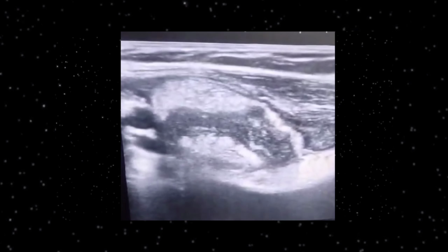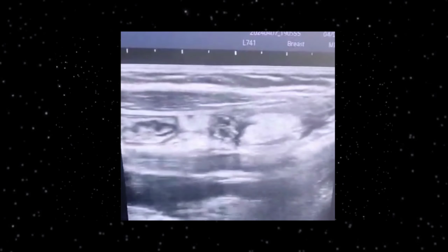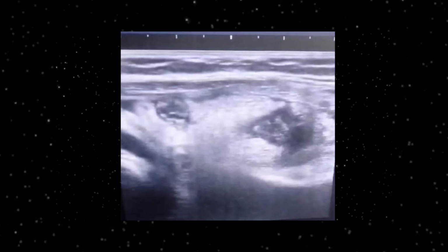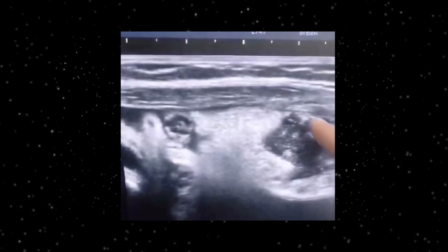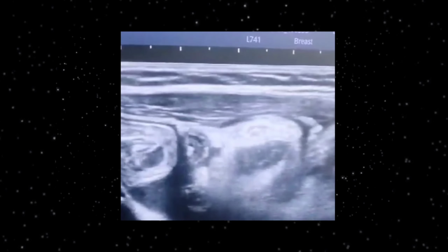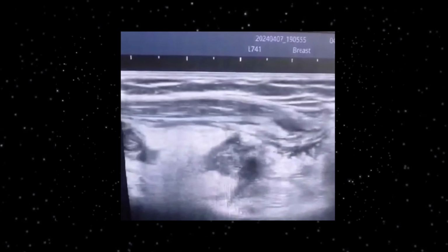This is the example of acute appendicitis. Here on this ultrasound image you can appreciate this well defined, non-compressible bowel loop, and this is what appendicitis will look like. Here you can see this is quite clearly visible, and if you come across with these you should label this as an acute appendicitis.